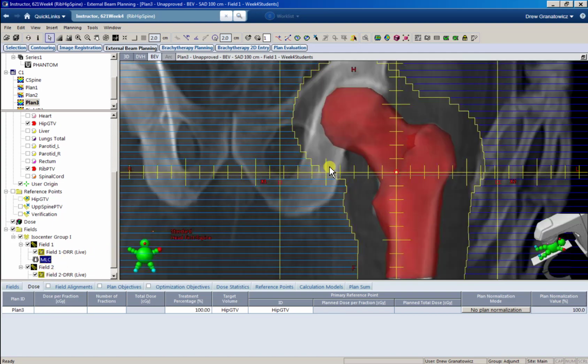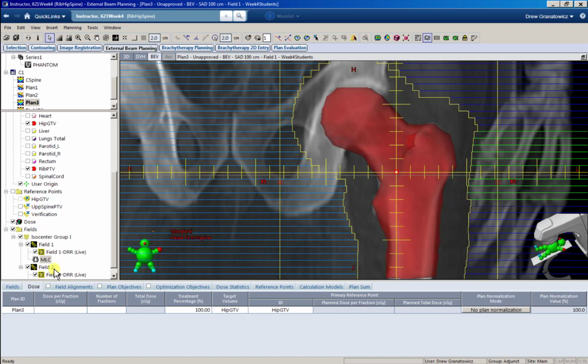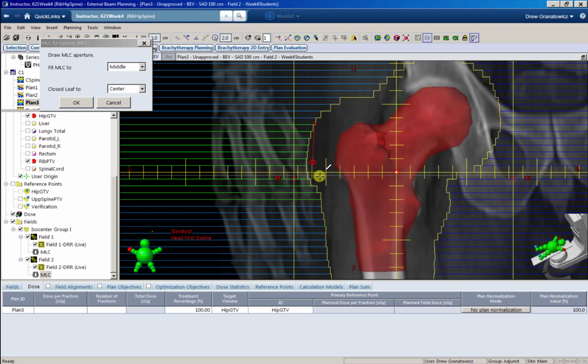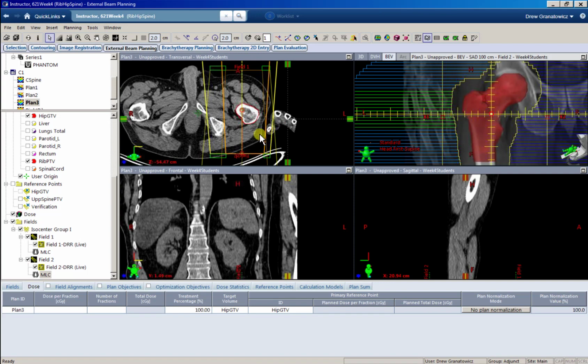it's probably a good idea just to, we can cover that up. Something like that. And I mean, we also could just leave it and instruct the therapists to make sure the hand is out of the field.